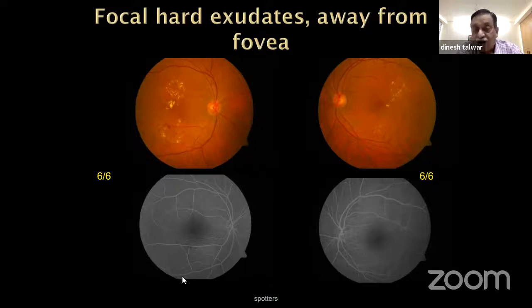See, you should be very careful. Actually, he's seen the whole fundus. He knows this patient had a moderately severe or severe NPDR. So he could make that comment. But can you make that comment based on this photograph? And this is a problem we have very often, because based on this photograph, you can't comment on it. Okay, so this was number one.